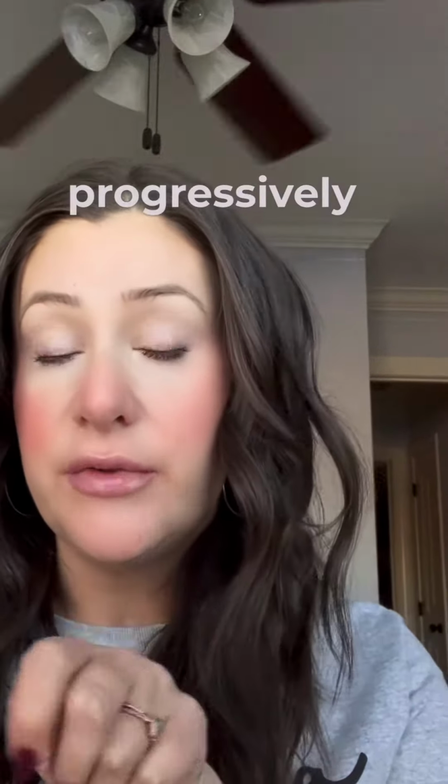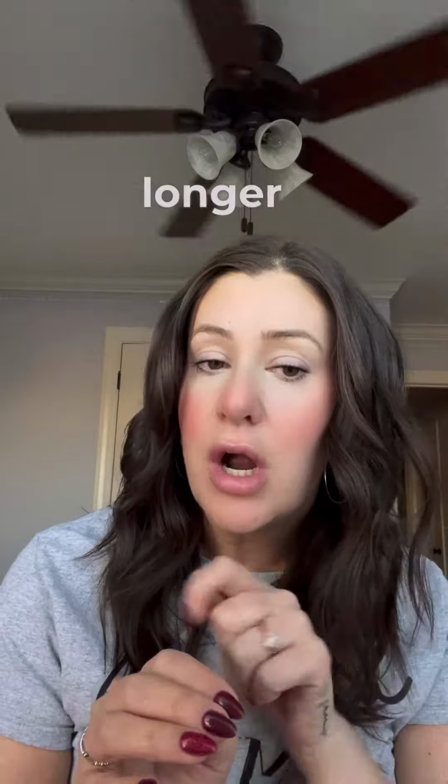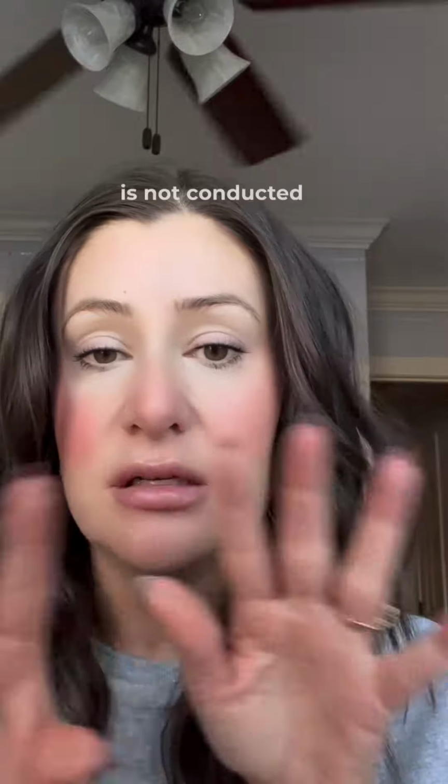So that one was a 2nd degree AV block type 1, or a Mobitz type 1, or a Wenckebach. It's called so many different things, but what you'll notice about a 2nd degree type 1 is that the PR interval is winking at you. In other words, the PR interval is getting progressively longer and longer and longer before a QRS complex is dropped altogether, or a P wave is not conducted. So you'll see a lonely P wave out there with no QRS complex to follow.